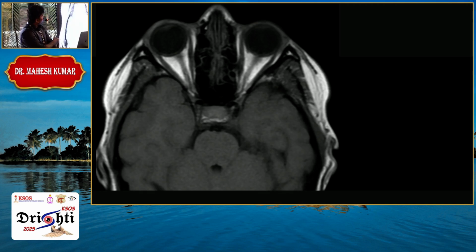This is the T1 image, and let us review the same anatomy that we reviewed on axial CT images. Same, this is the long, slender, thin optic nerve. See the symmetry over here, and see the symmetry of extraocular muscles also. Medial rectus and the lateral rectus, and the midline sphenoid sinuses, and posteriorly this is a sellar structure, and posterior to that we have midbrain and brain structures.